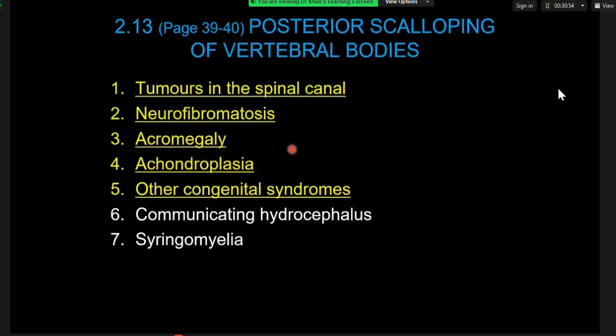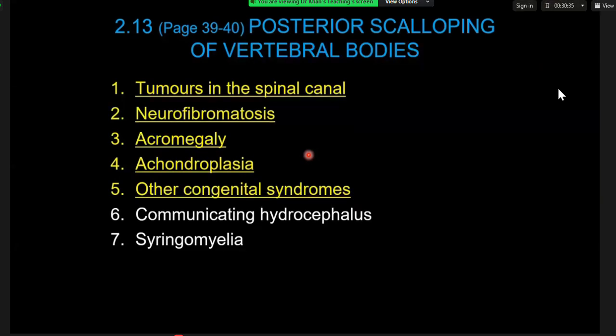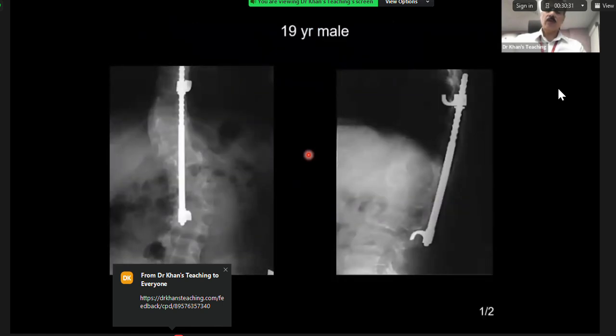So this is a chronic condition. No, okay, among these four, pick up one thing. Could this not be neurofibromatosis? Okay, very good. Okay, well done.